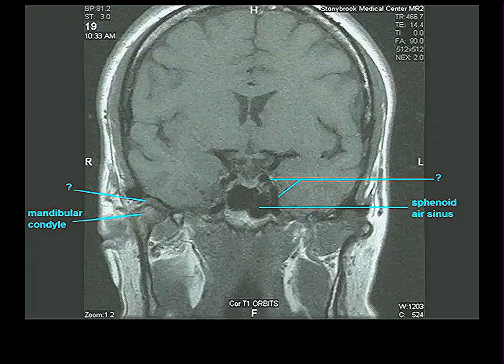It's something within the cavernous sinus, which is the internal carotid artery on this side. We see it actually coming up at the back of the cavity. It comes up, shoots forward, and then leaves again. So that happens to be the internal carotid artery.